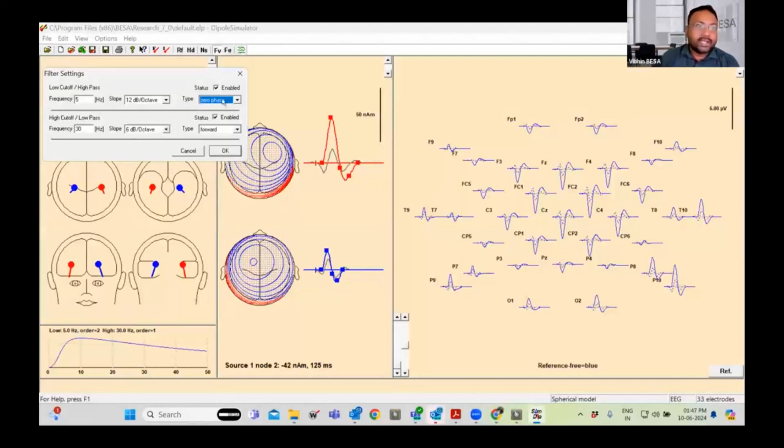So that said, let us try to change this back to 1 hertz, far away from the frequency of interest, which is 5 hertz. This looks fairly good. Now I change the high pass filter to 10 hertz. Still the waveform has slightly moved, but not much. It has just slightly moved, but then we have not introduced any more factors to it.